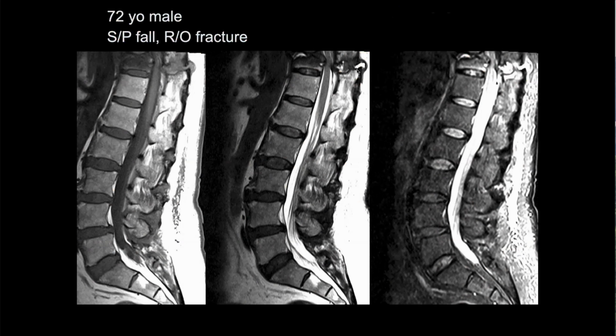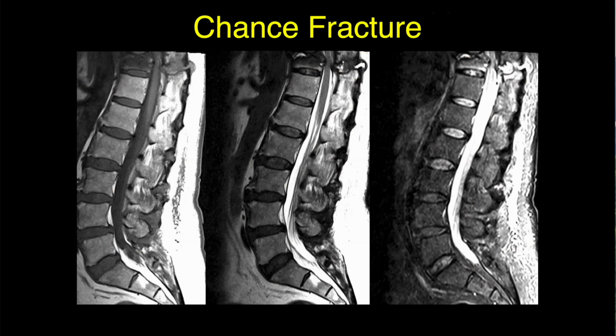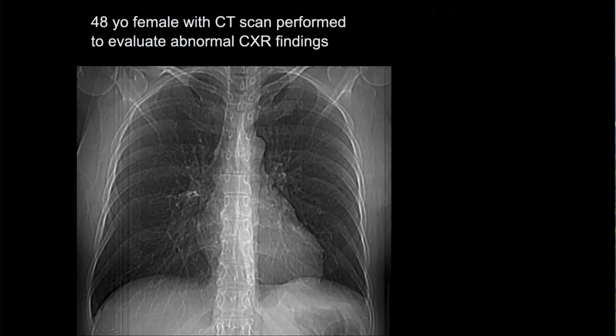That's the classic way this fracture occurs, and it's called a chance fracture. You can see that these can be unstable because the posterior ligamentous complex is disrupted here. So this has a potential of being a much more unstable lesion than the others we've looked at. And already we have central stenosis with probably compression of the cord in this location. So I think that goes with the seat belts. Yeah, this looks like a seatbelt fracture. Okay.